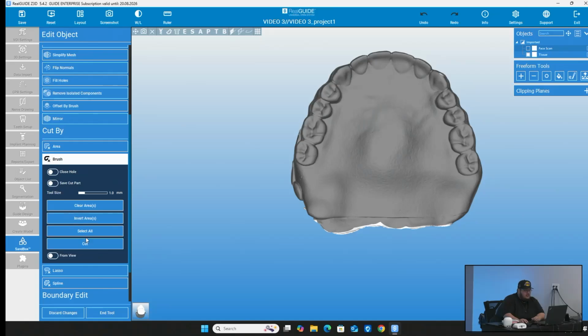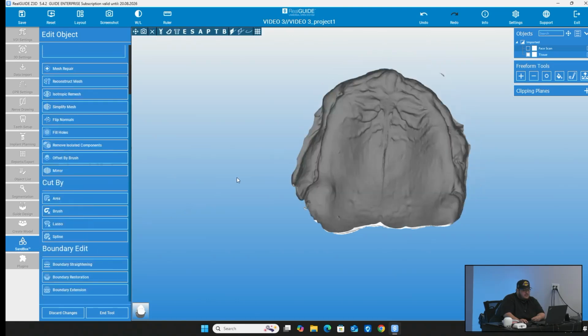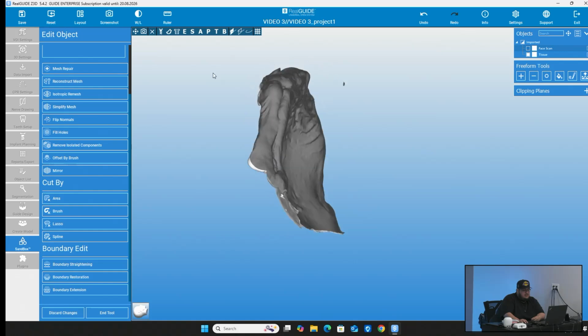And then of course you can do select all. So say you wanted to select everything and just invert it, which I'll show you. We'll do that after we delete it. You can definitely do that too. But what we want to do is go cut. So you're going to just cut, and you'll notice that it was all taken away.